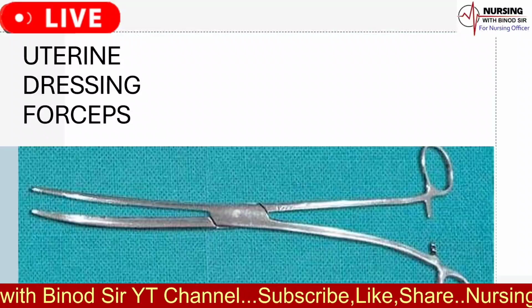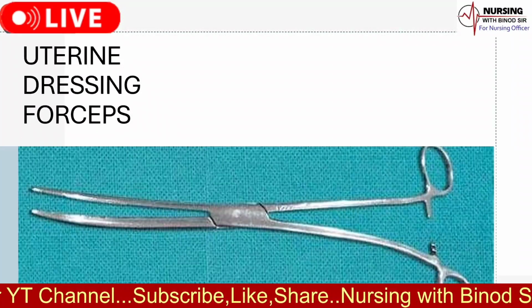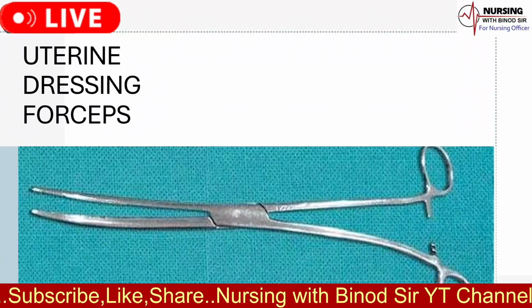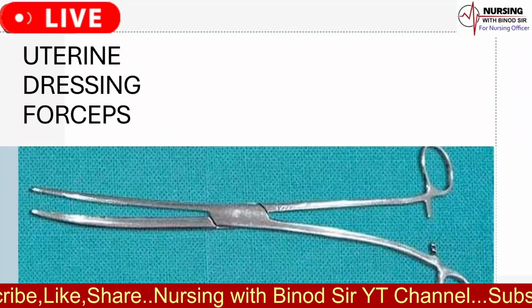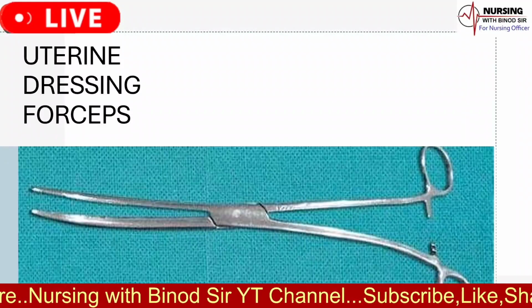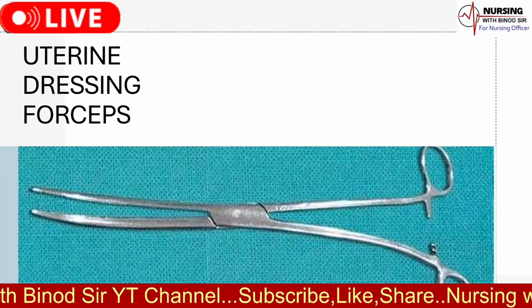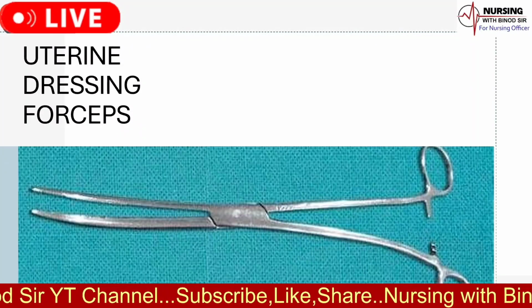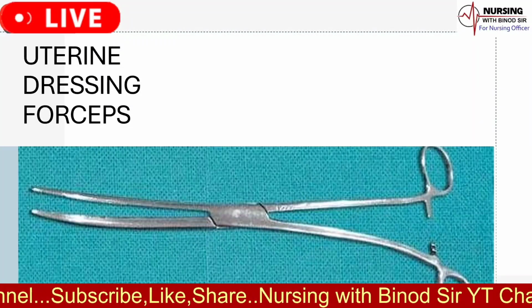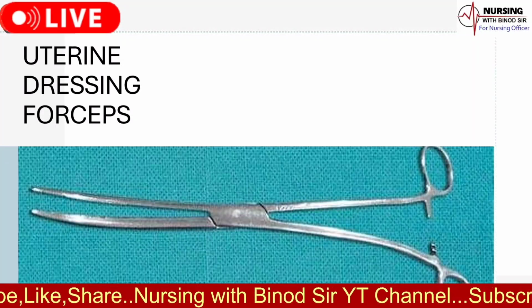4. Hysteroscopy. Uterine dressing forceps are used in procedures like hysteroscopy to handle uterine tissues. 5. Dilation and curettage, D&C. They assist in the curettage of the uterine lining. 6. Endometrial biopsy. They help secure and manipulate tissues during endometrial biopsy procedures. 7. Myomectomy. Used in myomectomy to hold and manipulate tissues. 8. Ovarian cystectomy. They assist in procedures like ovarian cystectomy by securely grasping tissues.